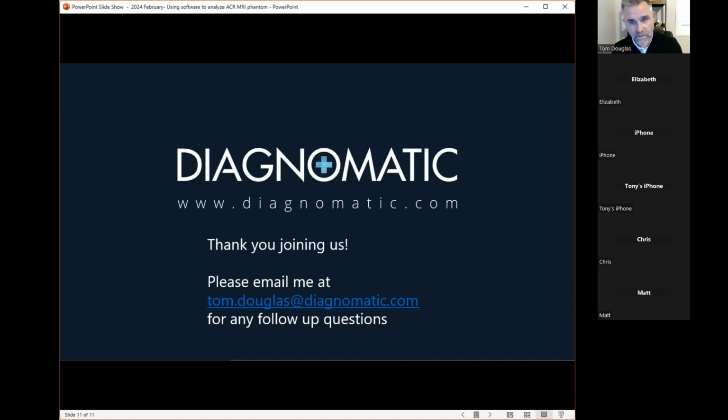But that's kind of it in a nutshell. I went through that kind of quickly. I think I did a couple other times, so I think I'm flying through it at this point. Hopefully I didn't gloss over anything. But again, I really just wanted this to be a quick look of how to get through the software, and if you want to show somebody how to actually run a test.